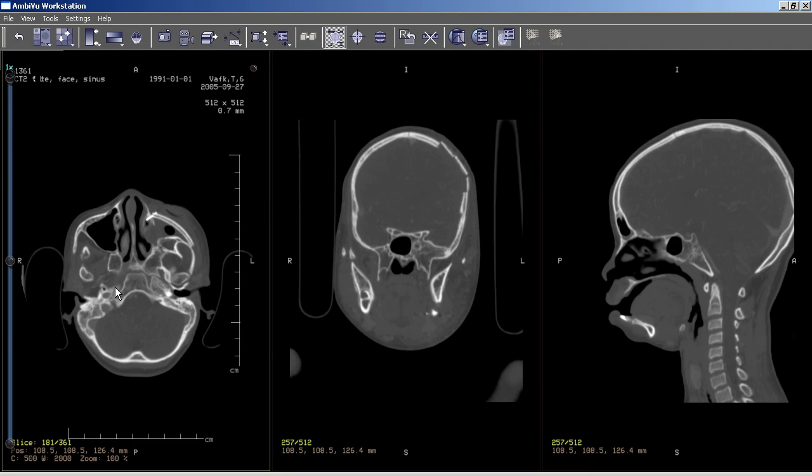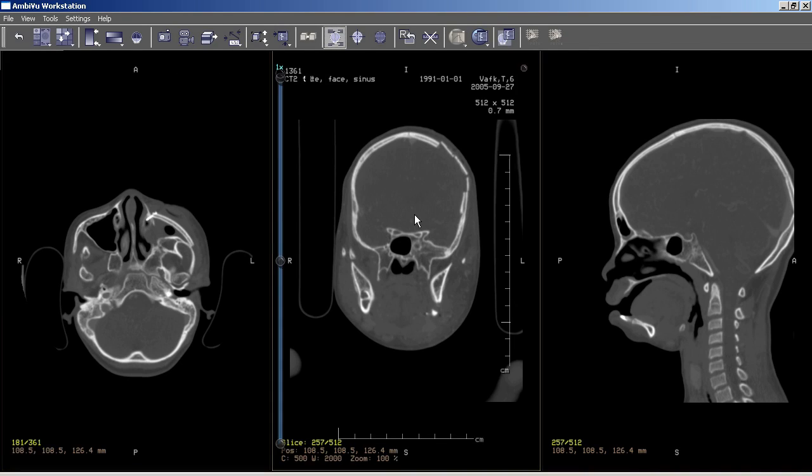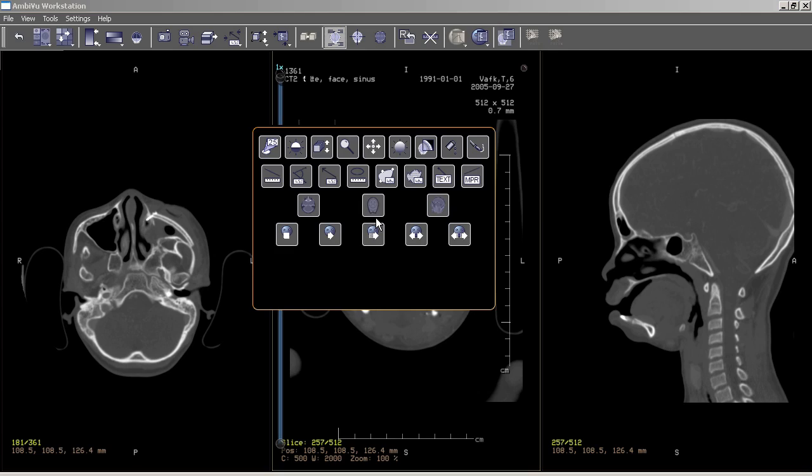In this presentation I'm going to talk about the annotation system. The annotation system is invoked through the right-click menu. The second line of buttons gives us an option of different annotation tools. All of them have more or less the same functionality.